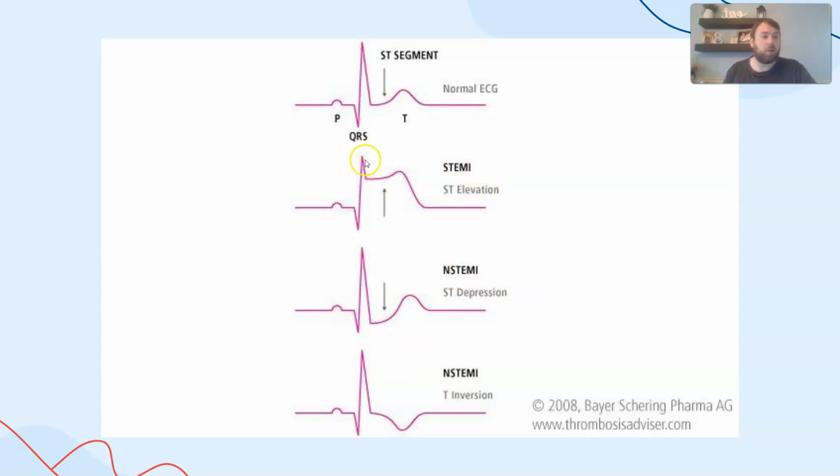This would be a total occlusion, a total blockage in one of the coronary arteries. But this is also not great. This would be a partial blockage or a backflow in one of the coronary arteries, meaning that yes, some blood is getting through, but not the amount that it needs to happen.